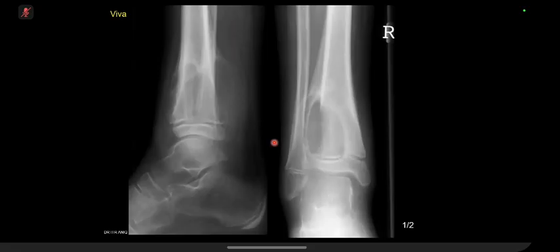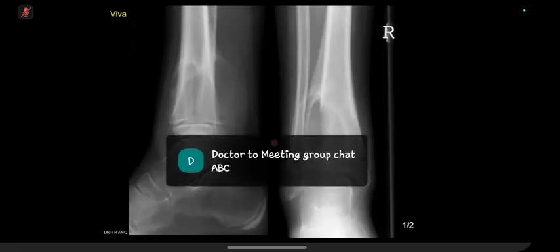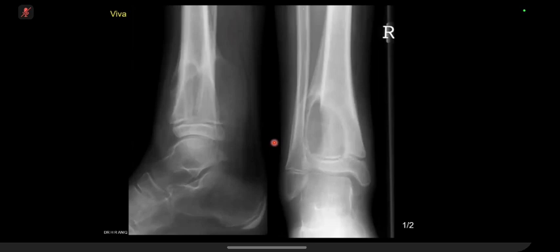The internal matrix of the lesion is not osteoid or chondroid, but the associated features are quite that of an aggressive lesion, so it has a wide zone of transition, I'd say. My differentials in a child of this age would include an Ewing's, that also include lymphoma, even though the bone matrix does not look as permeative here, but I'd consider an aggressive bone lesion here.